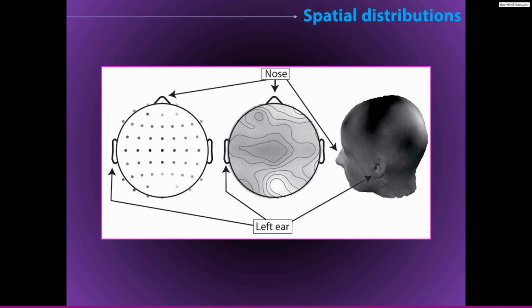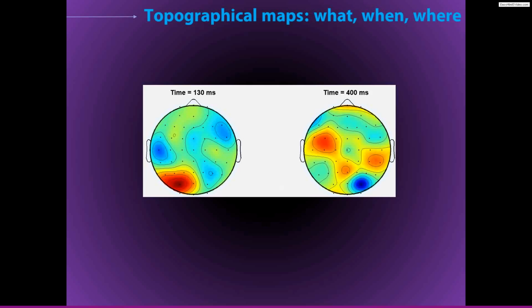Topographical maps are very important. They are very powerful and should be used very often. In particular, not only when you are inspecting your results and showing images of your results after you've completed your analyses, but also during pre-processing and during the cleaning and initial inspection of the data. Topographical maps are very powerful, and you can extract a lot of meaningful information very quickly.